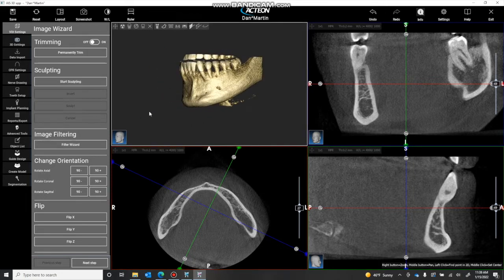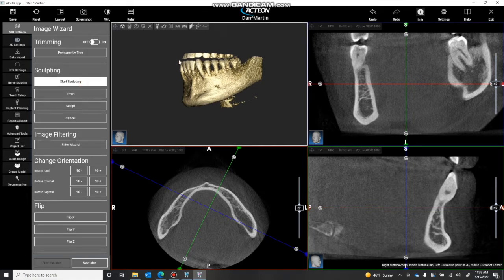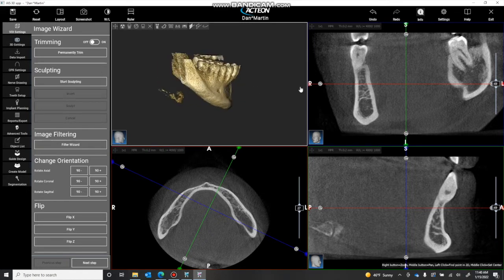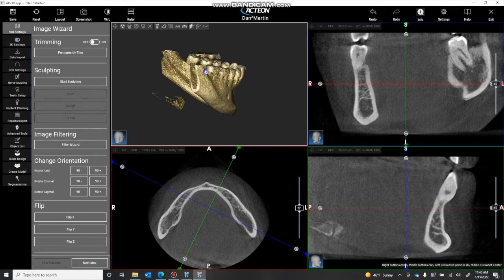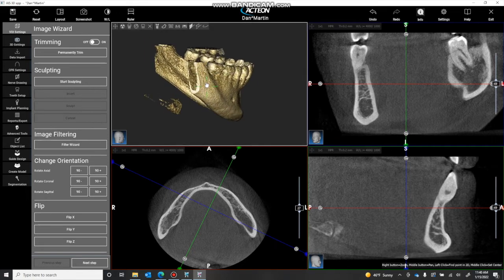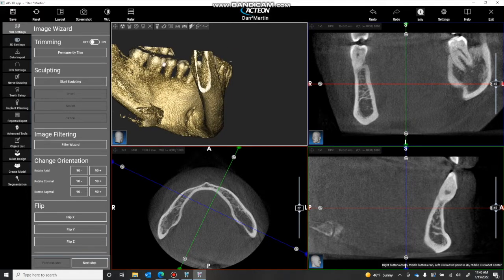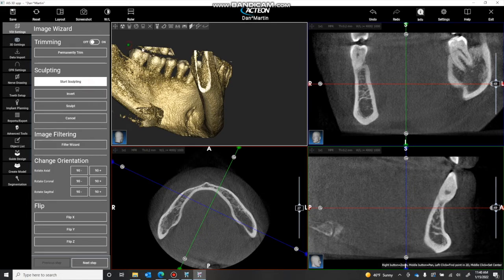And then we'll go ahead and angulate this the same way over here. Start sculpting. We'll just do that for now. Boom. And then now we've got just this little bit here, which actually might be easier to take from this side. I'm going to right click and hold and zoom in. And now you'll see, boom, this is free floating with nothing that I need to be worried about. Real easy.